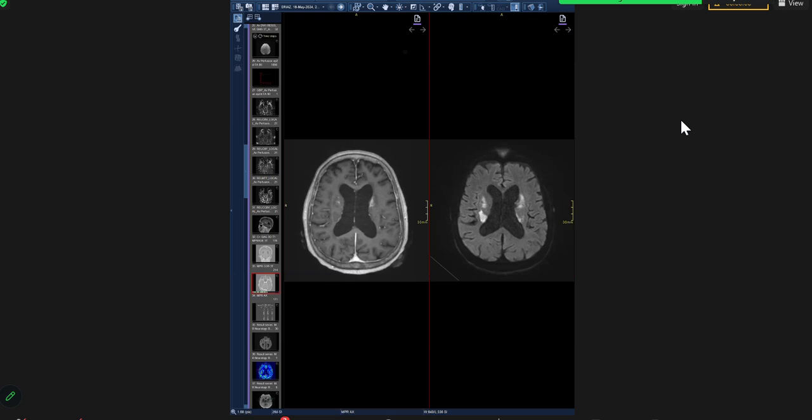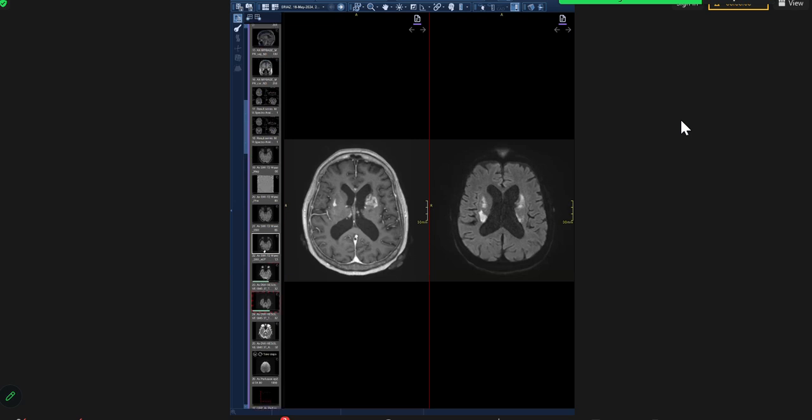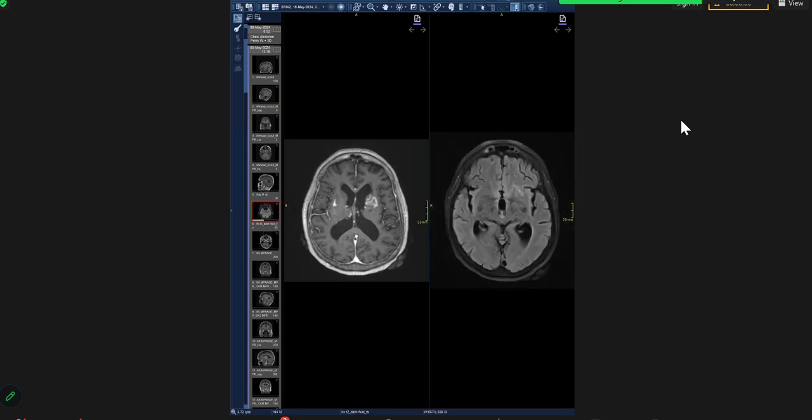In this image, I can see that these lesions show contrast enhancement, a peripheral thick irregular contrast enhancement. But I don't appreciate any associated edema. Considering this contrast enhancement pattern as well as the diffusion restriction, differential possibilities, this could be abscesses, but they are showing a thick enhancement.